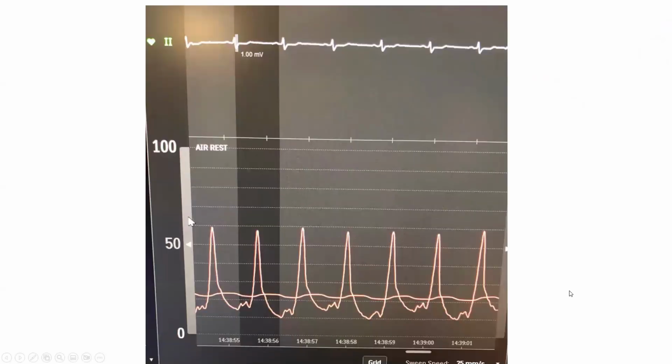This is another case. What is the chamber in that case? This is the exact same thing. This is a wedge pressure with a massive V wave. Again, narrow, peaky wave, peaking after the T, with horizontal or upsloping intervals in between the peaks. This is not a PA, this is not an RV. This is a wedge pressure with a massive V wave. Again, likely decompensated mitral regurgitation, although it could also be severe heart failure, less likely when it is that big, more than twice to 2.5 times the mean wedge.